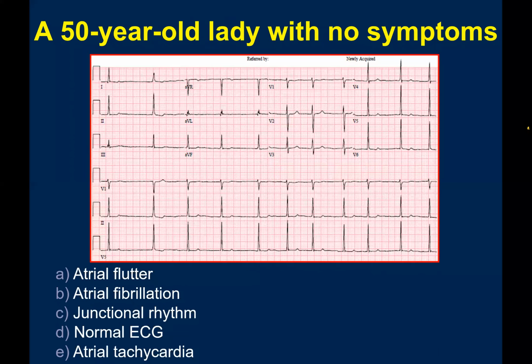Okay. Next question, 50-year-old female with no symptoms, and this is the 12-lead ECG. She's in the clinic for routine follow-up.